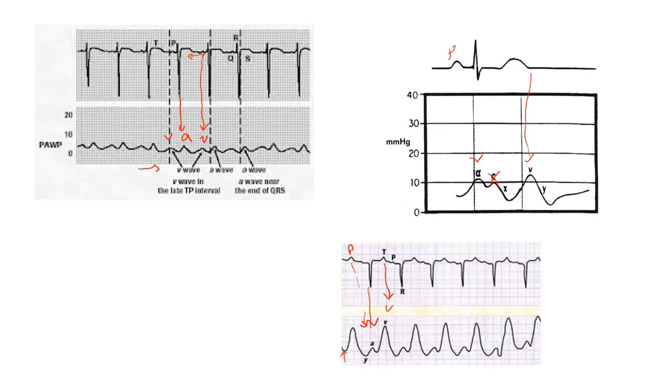If we think about this corresponding to ventricular systole, what's going to make that pressure huge is if there is a leak in that mitral valve, so that pressure can push backwards from the ventricle. So this is a large V wave of mitral regurgitation.